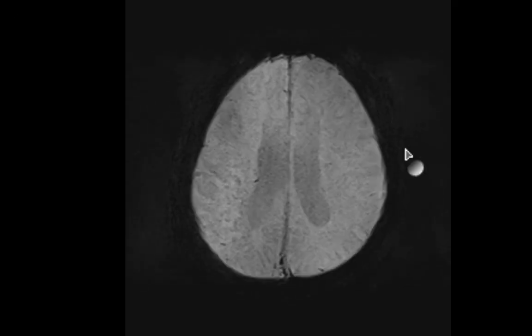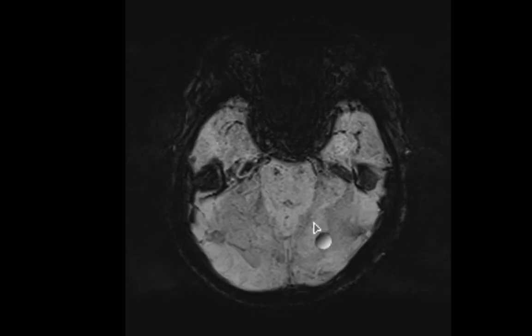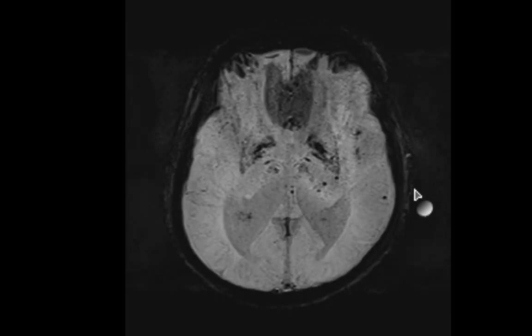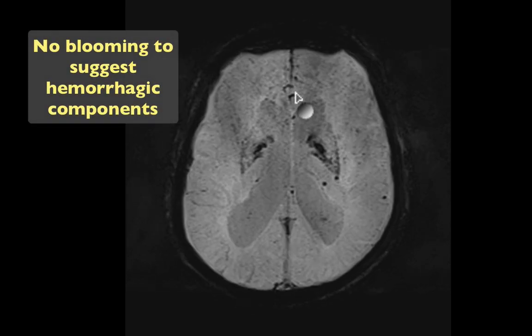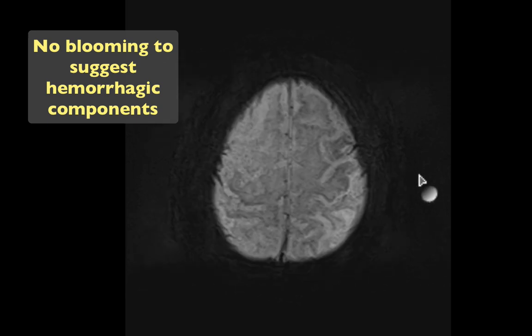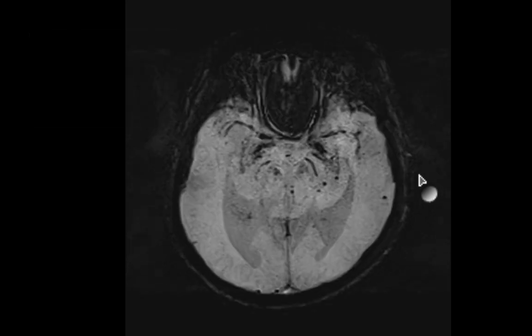This is the susceptibility weighted image. A quick look at it demonstrates no obvious abnormalities apart from a few dark spots here and there, which may be related to microangiopathy. However, the region of involvement does not show any obvious concentration of artifacts in the mesial temporal lobes or in the inferior frontal lobes or even in the insula. And the reason we're looking at that, you want to make sure that the areas of involvement by the infection are not associated with hemorrhagic components, which could happen.